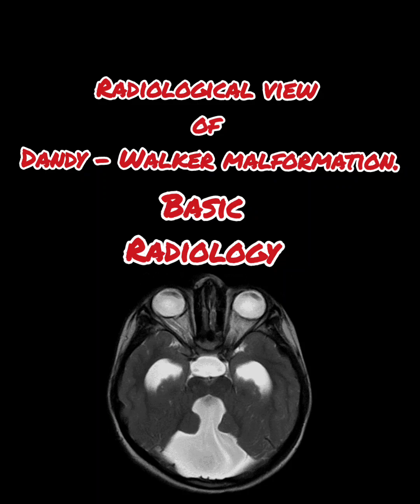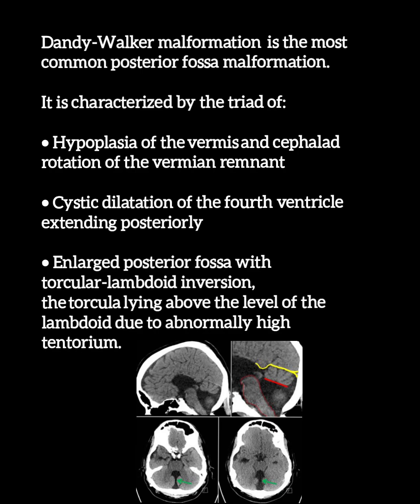Radiological view of Dandy-Walker malformation. Dandy-Walker malformation is the most common posterior fossa malformation. It is characterized by the triad of hypoplasia of the vermis and cephalad rotation of the vermian remnant, cystic dilatation of the fourth ventricle extending posteriorly, enlarged posterior fossa with torcular lambdoid inversion, the torcular lying above the level of the lambdoid due to abnormally high tentorium.